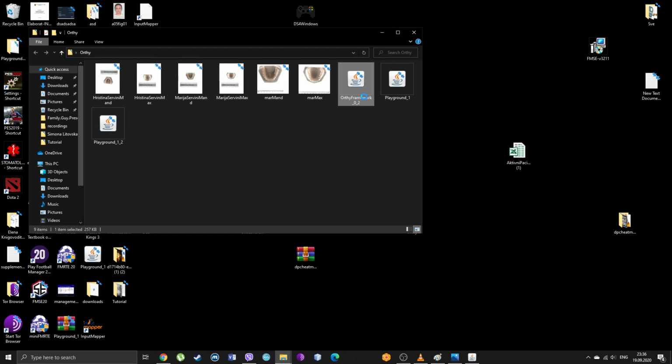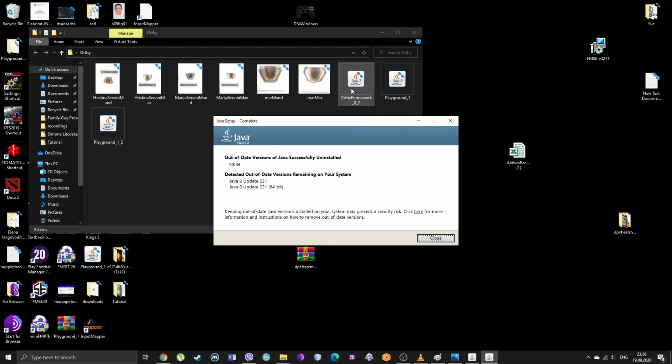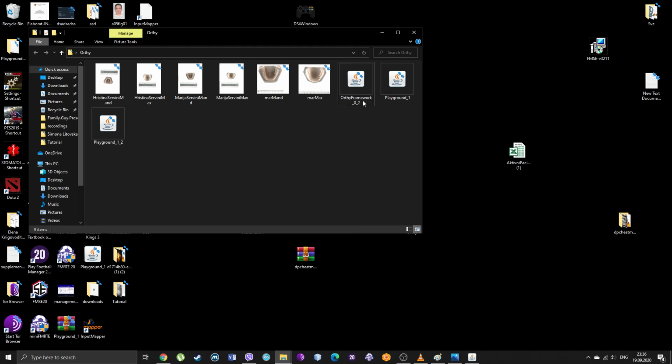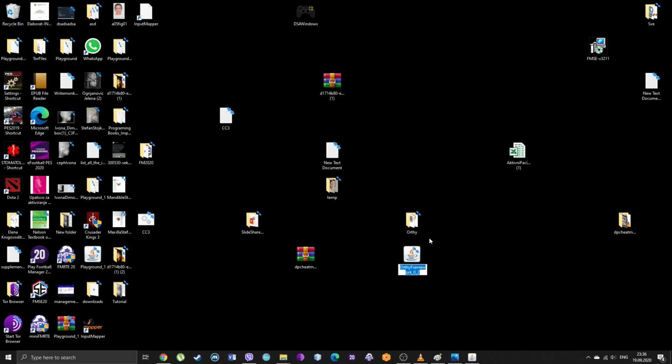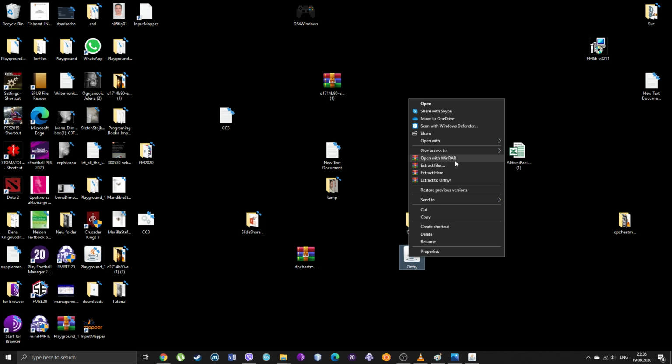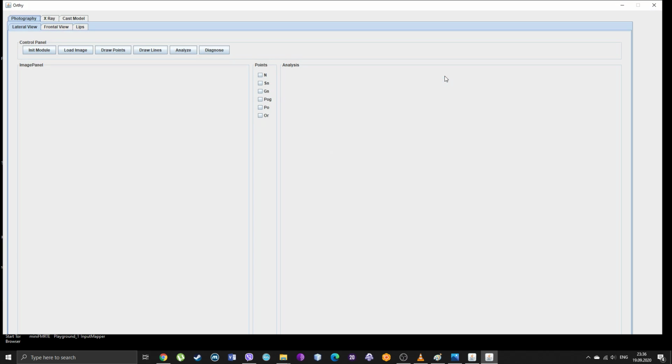Okay, I'm gonna copy it here. I'm gonna rename it first. Rename it to Orthy. This is it. You just take this icon here. You're gonna receive it in a zip file. You unpack it. You extract it somewhere wherever you like. You just click it, and there you go.